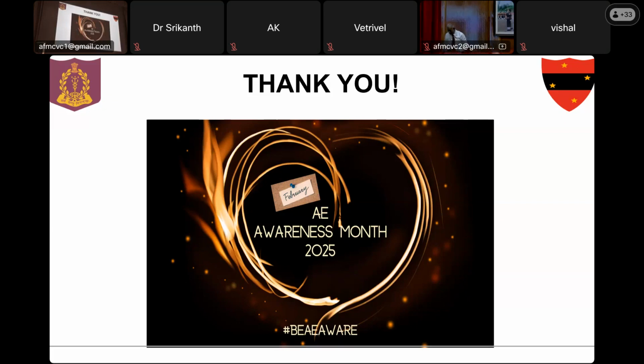Yeah, Manish, I just wanted to say that among the various radiological classifications that you showed, differentiating among them depends upon what other associated findings you will have. Like for the striatal pattern in CJD, you will probably have the thalamus involved, and in the other differentials, you will not. Or in the medial temporal pattern, if it is HSV, you will have the cingulate involved, in others you will not. So nicely done. Thank you.